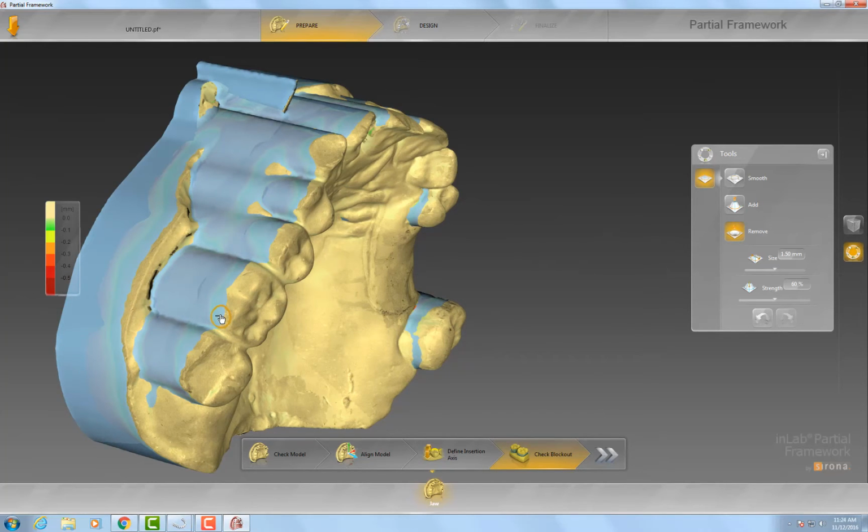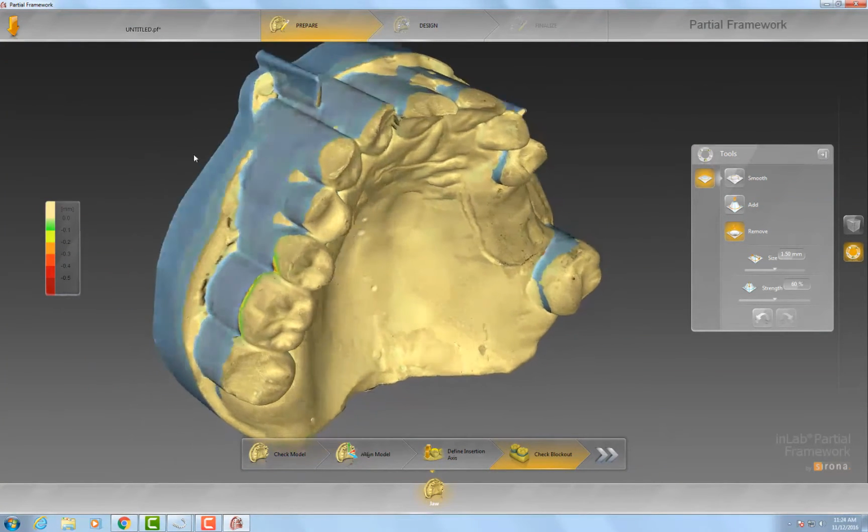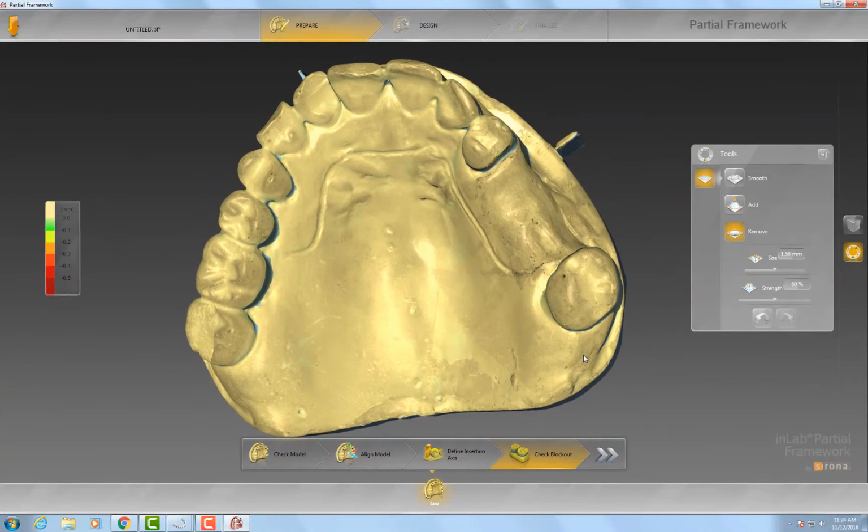Alright, so then we'll just go right here. And if I'm speaking too fast, please let me know. I can slow it down. Sorry, I'm a very high energy person. Anytime I talk about IPF software, I get super excited because I just really like to share what this system and what it can do for your lab and how much it can help you. I just can't get over how much it has helped me and how well it's been for my lab.